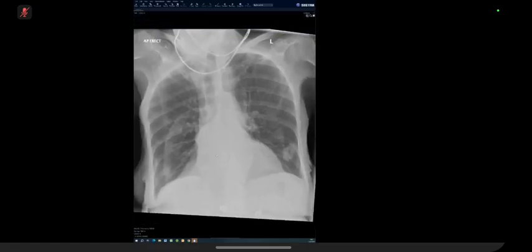Okay. Let's assume that it is in the lung. I want to hear you close the case and tell me what to do next. Okay. So in summary, this would be a left lower zone opacity. I don't know what the history of the patient is. If this is not known. Hemoptysis. Okay. In that case, this could be a cavitating lesion within the lung. So if the patient is stable, this would warrant a CT of the chest to look for cavitating nodules in the lungs.